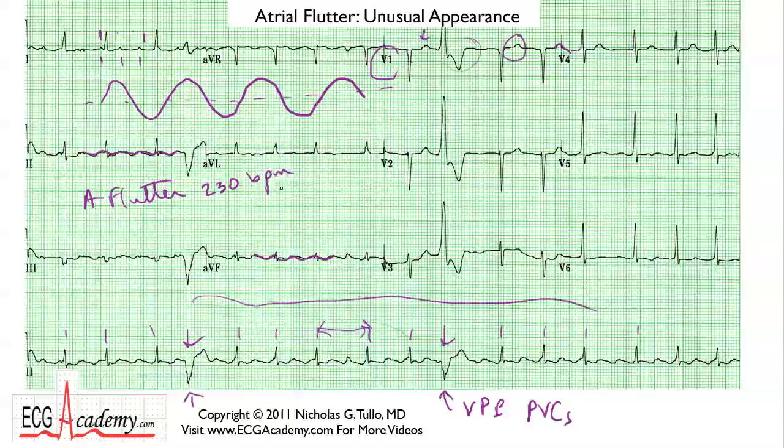When you get to the intermediate course, we start to analyze the details of the QRS complexes and look for other things like ST and T wave abnormalities. But for this basic level course, what we're concentrating on mainly is the rhythm, because that turns out to be the most complicated part of the ECG. So even though I call this a basic level, in fact, you're getting some very complex physiologic lessons and insights into reading rhythm strips, information that you won't get in any other course on the internet.